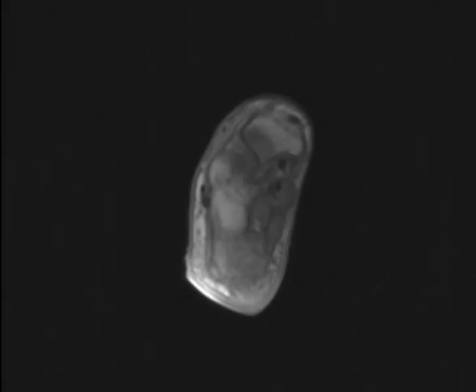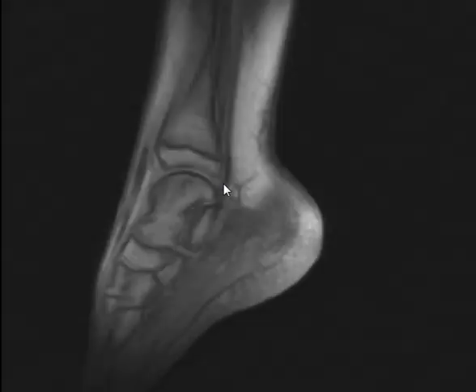Just a second, give me 1 second. Yeah, go. So what's this sequence?